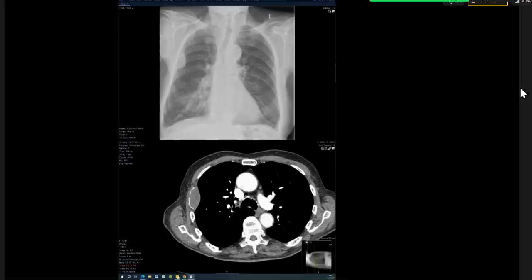For example, in this age group, because I think this is an elderly patient, just looking at the chest X-ray, I would think of myeloma as the second most common differential, a plasmacytoma if it was a solitary lesion, and I think it is because we've just said there's nothing else. And so in that case, I would refer to the relevant MDT, and I would biopsy the lesion. Yeah, this is biopsy proven plasmacytoma.